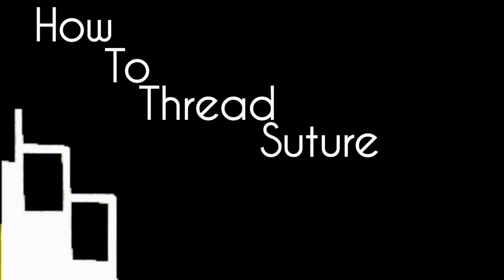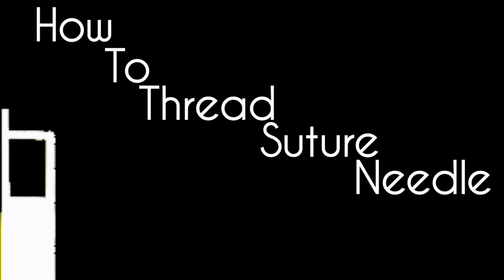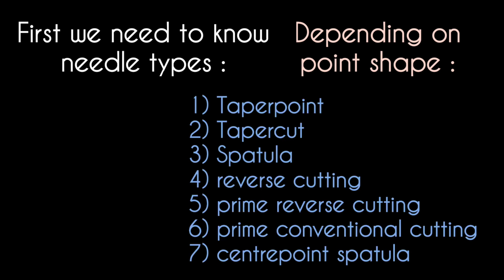See how to thread suture needles. While starting, first we need to know needle types.